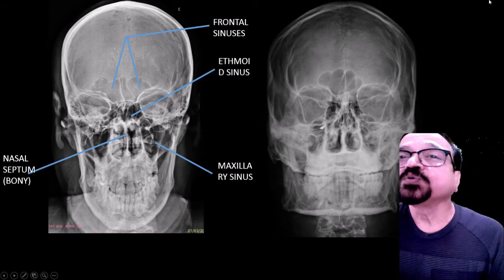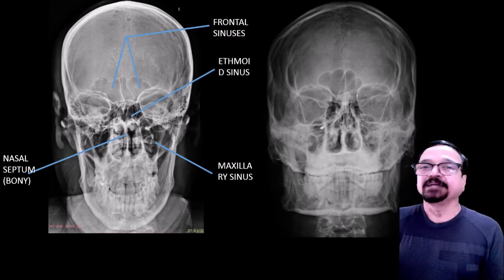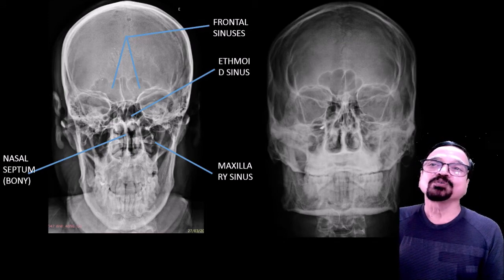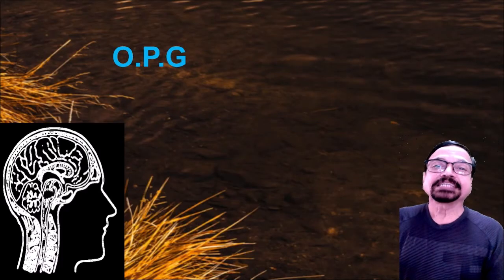And if you do not achieve the angle, like it starts looking like PA, then you increase the angle. Sometimes it happens that you are giving 15 degrees angulation, but the X-ray comes in the way I have shown you. In that condition, you will have to increase the angulation from 15 degrees. It is always said that radiography has no fixed angle. You will have to see the film and you might have to modify it. We have seen mandible AP, oblique and PA.